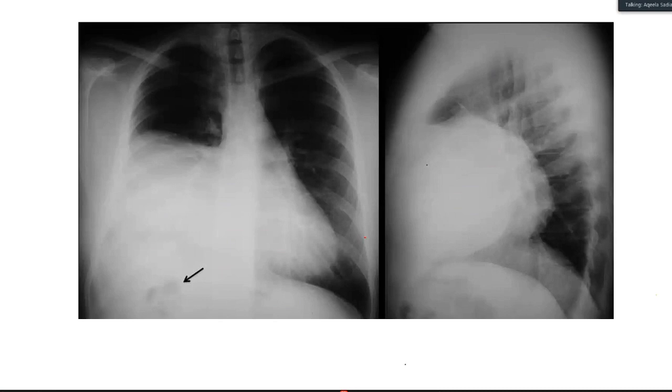This is not forming anything specifically related to the bowel, I think. Okay, I cannot see. There is a lucency. It is either bowel or an abnormal gas shadow of some kind. So, can you correlate both findings?